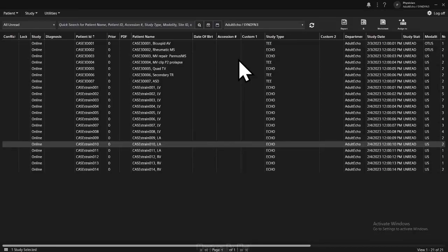What we want to cover today will be mostly diastology, with Dr. Klein and Dr. Sengupta having a conversation about the new guidelines and how we apply them with cases. I do want to show you just one example of how we would do an LA strain case and how easy it is to do LA strain.